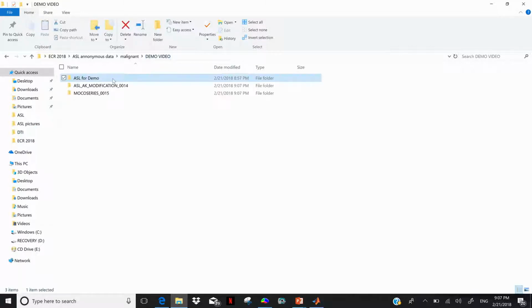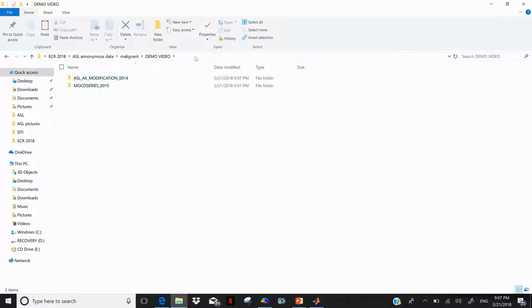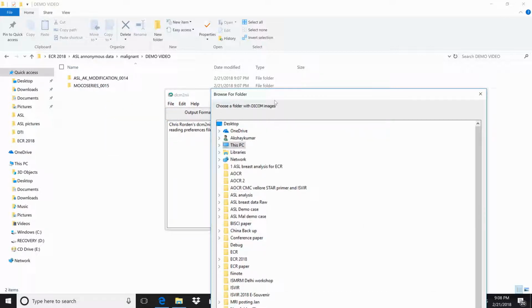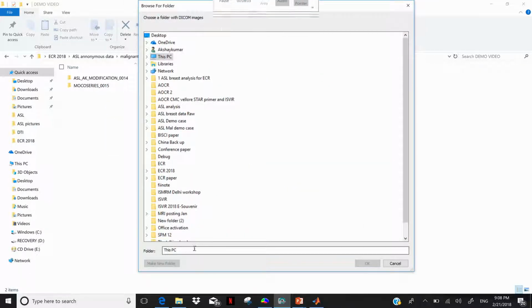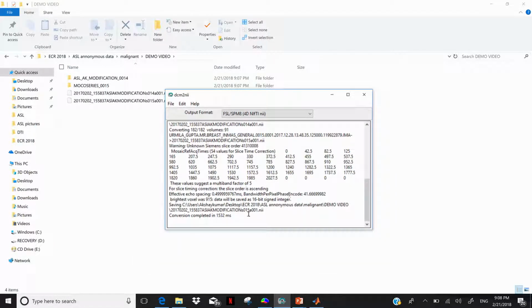So this is useless. So I need to delete this too. Yes. So we need to repeat this step again now with the same software. It's not really difficult now because now you know how to do it. So I'm just doing it again. Maybe this is better so that it reinforces. This takes 3 times more because those are 91 images.